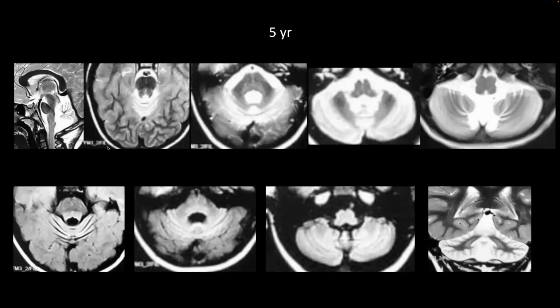Then we had a follow-up. The follow-up again has selected images, again demonstrating these atrophic changes in the cerebellum. You have a FLAIR sequence over there on the bottom panel, and you can appreciate that there is FLAIR hyperintense cerebellar cortex.